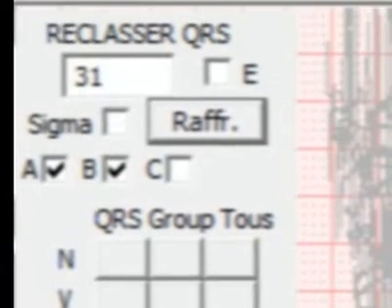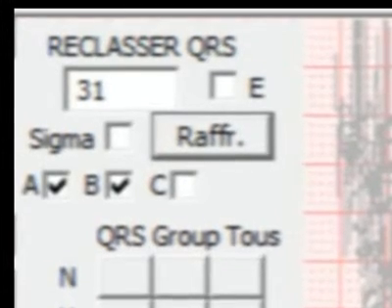The lines correspond to the different categories of QRS. N for supraventricular beat, V for ventricular beat, C for aberrant conduction, PM for paced beat, OV-det for over-detection. The additionally detected QRS completely disappears, and the RR period is recalculated. ART for artifacts. The button located at the intersection of the column and the line immediately reclassifies the selected QRS. The selected QRS counter appears at the top.